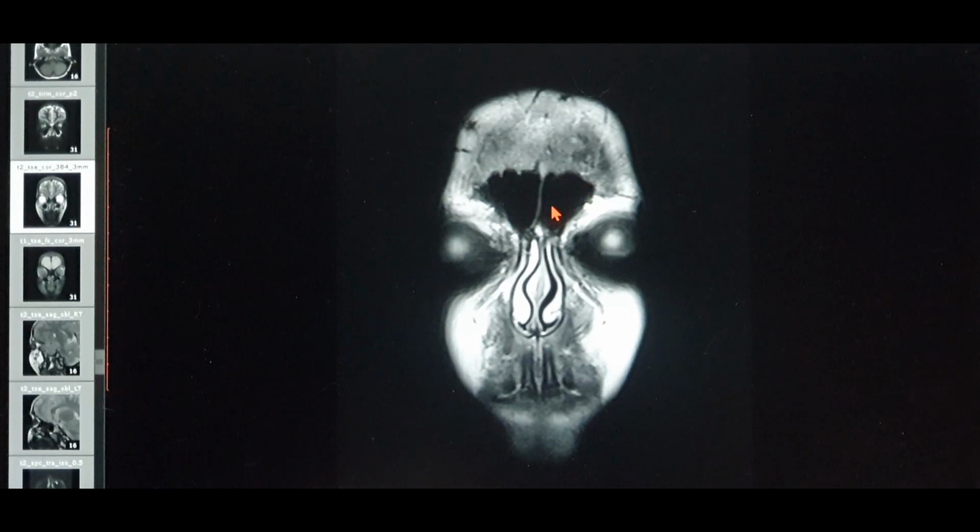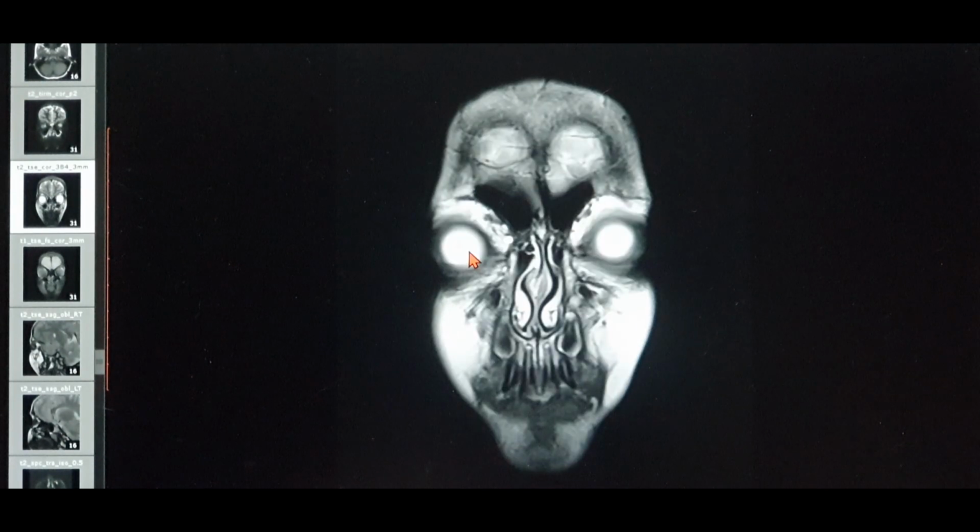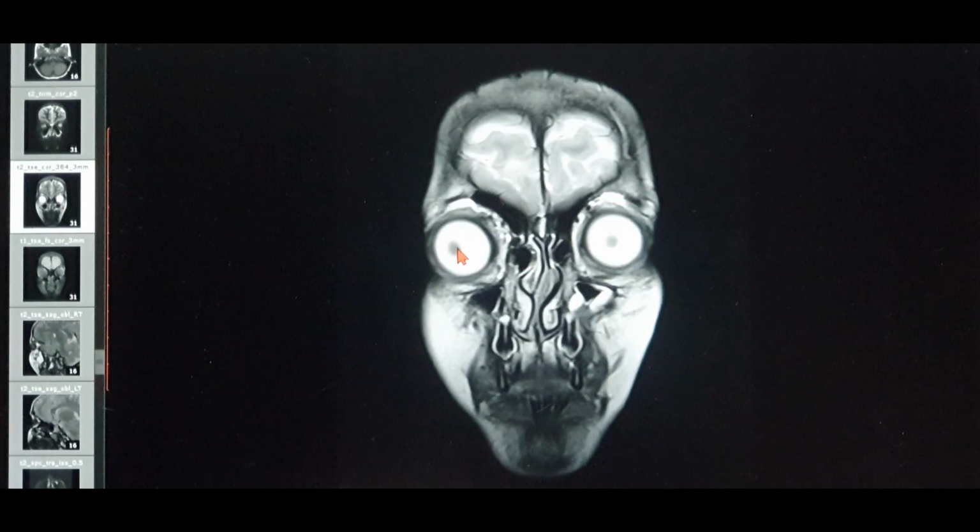They may even ask you to locate the sinuses on an MRI scan as well, not only on the CT scan. So you have to look for the eye globe. In the case of a PNS or MRI brain, look for the eyeball. The eyeball appears as two bright balls, and you can see the lens over here, which appears opaque. This fluid is nothing but the aqueous and the vitreous humor in the eyeball. Once you see the eye like this, it is definitely a T2.